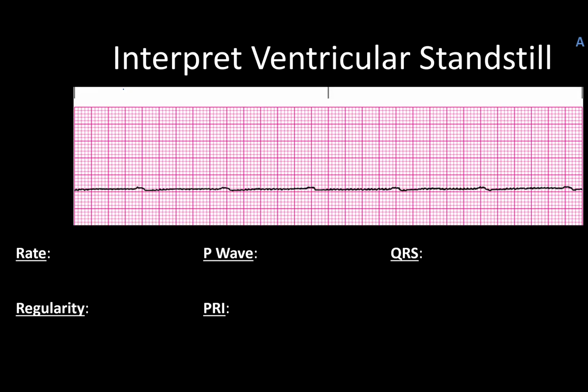I've said it before and I'll say it again: check the patient. Compressions, because I'm going to guess you won't find a pulse with this one. Mark these off real quick. 1, 2, 3, 4, 5, and 6. But that is just the atrial rate, because the ventricular rate is absolutely 0. There are no QRSs to be found on here whatsoever.